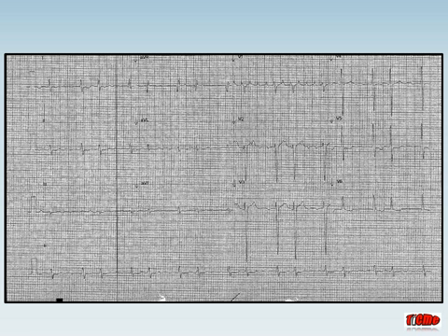Okay, here's our next example. Let's have a look at the baseline to start with. Again, it appears to be irregular. There appears to be a pattern of regularity within the irregularness of this baseline, however. Remember, if we're going to have an irregular rhythm, we first need to decide whether there's P waves. If you're not certain by looking in your rhythm strip, the best place to go looking is in lead V1. So what we're seeing here in the isoelectric period are blips in the line that look like they might be P waves. So the question is, are these P waves causing ventricular depolarization or not?